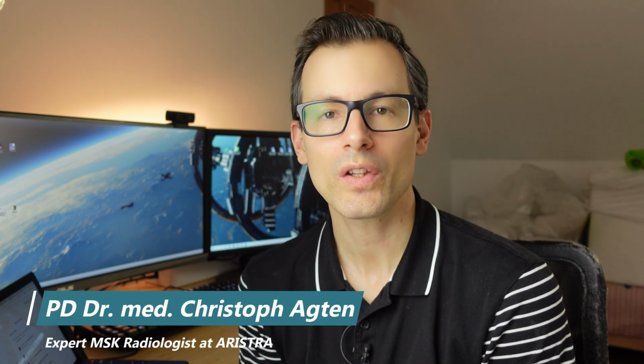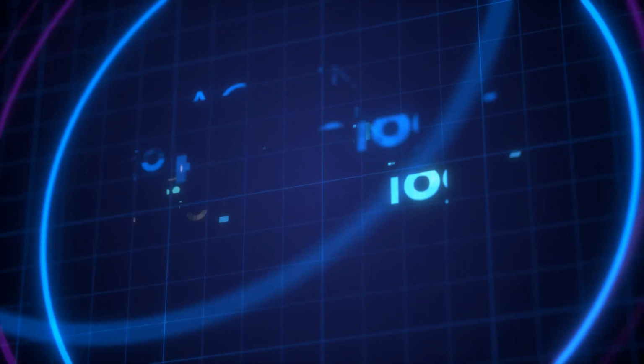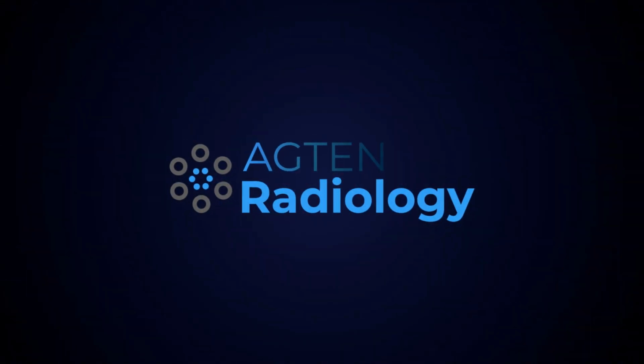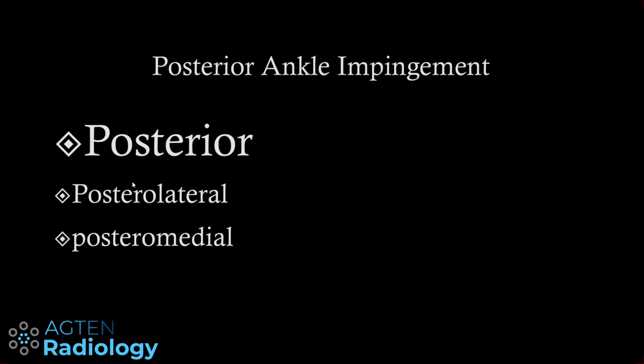In this week's video I will talk about posterior ankle impingement and how it looks on MRI. This video will mainly focus on posterior ankle impingement, but I might make one or two comments about posterolateral and posteromedial impingement.